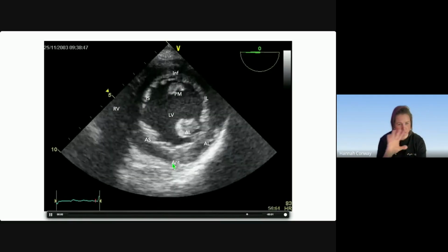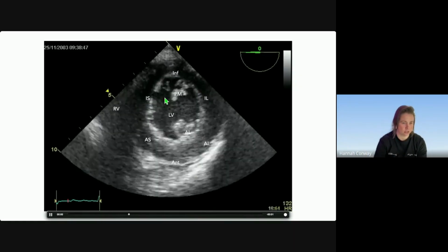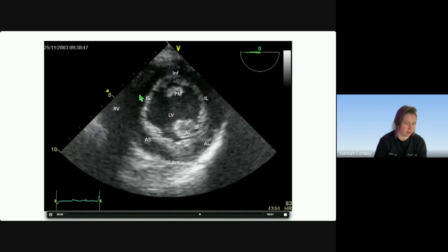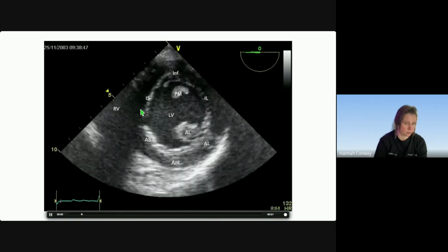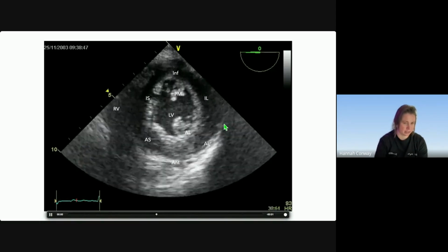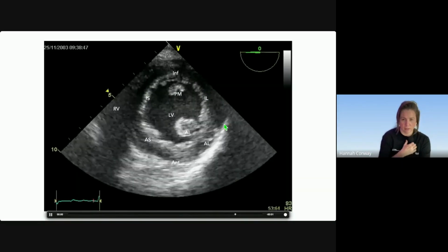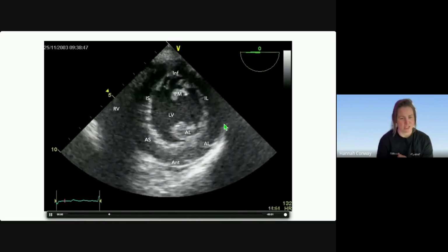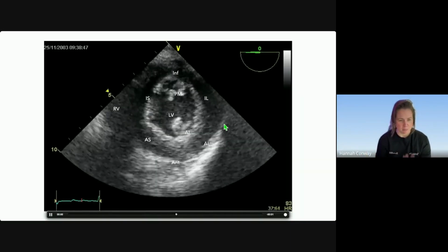The only thing we now need to do to make that 6th segment is just separate your septal and lateral wall into their respective inferior and anterior segments. So this then becomes your inferoseptal wall, anteroseptal wall, anterolateral wall, inferolateral. Okay, that doesn't necessarily work for everybody, but personally that worked for me. It kind of got me out of that worry, especially because I was learning transthoracic and TOE at the same time, so it was a complete nightmare, but that's a really good way to remember it.